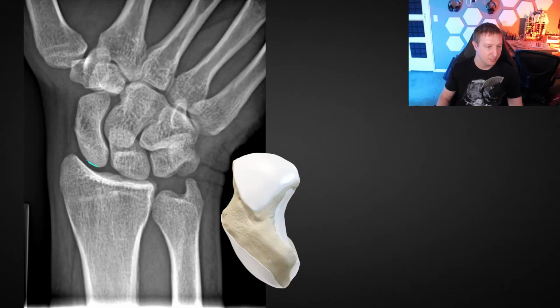And so you can see the radial articular surface comes up here and ends, and then we have this bare area up until we get to the trapezium and trapezoid articular surfaces. And so when you can see that bare area laid out really nicely, then you're seeing the scaphoid lifted up, if you will, from the tension that's placed under ulnar deviation. And another thing that ulnar deviation is great for is that it also allows us to see the scapholunate joint a bit better typically, and it will apply some stress there. And so if the scapholunate ligament is incompetent or torn, then you'll see widening or diastasis at that site.